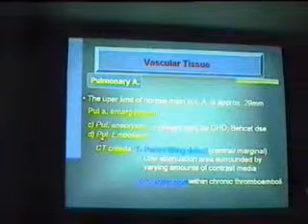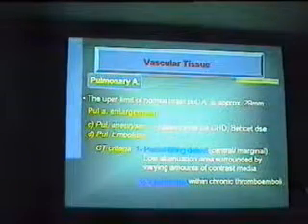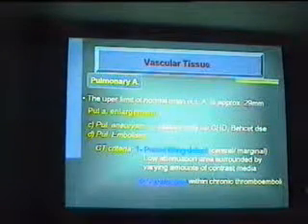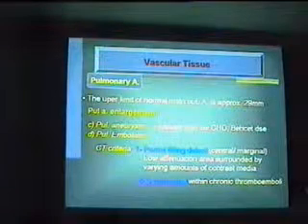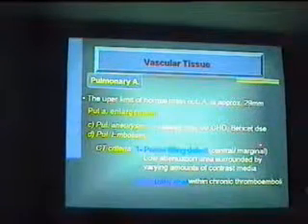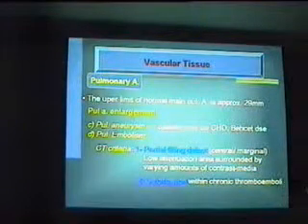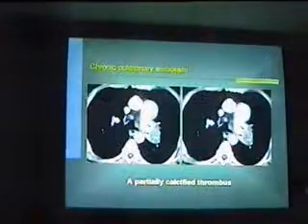Another cause for enlargement of the pulmonary artery is a pulmonary embolism. والامبوليزم في البلمونري artery زي في الأورتا، sort of a thrombus, a filling defect that may show calcification. Okay? والpartial filling defect may be central or marginal, low attenuation area surrounded by varying amounts of contrast enhancement and calcification within in cases of chronic thromboemboli.